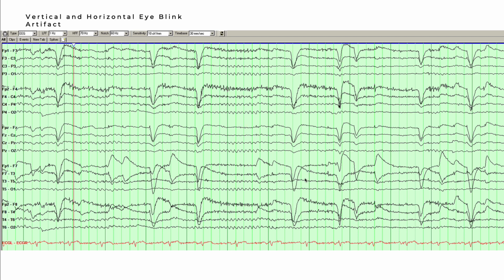Here again, you see a combination of vertical and horizontal eye movements in this recording. I want to draw your attention more to the horizontal eye movements. Notice how I switched a little bit here, where the temporal electrode chains are now down below. Which direction is this patient looking at this point in time where the cursor is? If you guessed left, you'd be correct again. And then, really just to drive this home, you see the same exact phenomenon here. And to remember back, it's because that positive cornea is looking left here, okay?